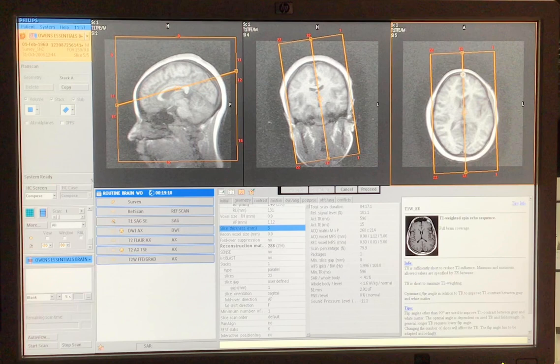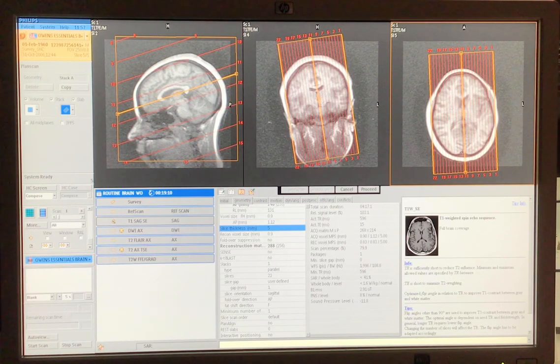If you wanted to do a slight angle, you can, because again, this is 3-dimension, so you can angle off of both of these planes. And anytime you do angles like that, you're going to get a little bit of a different line going through this field of view box. But don't worry about it, because you still got it nice and square. You set it up originally. And then you're going to go over here and do your angles here. So if you get these angles the way you like them, you can then go back and turn your slices back on. Okay? Or you can set them up just with the red lines on them, and that's no big deal either.